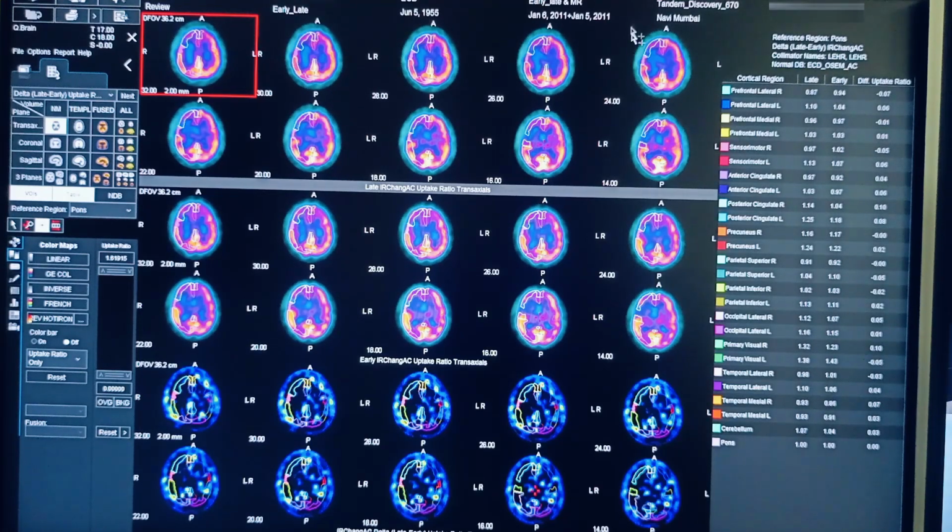If you double click, it will remain shaded. So what this table is showing is the major cortical areas where you have to detect the cortical defects.